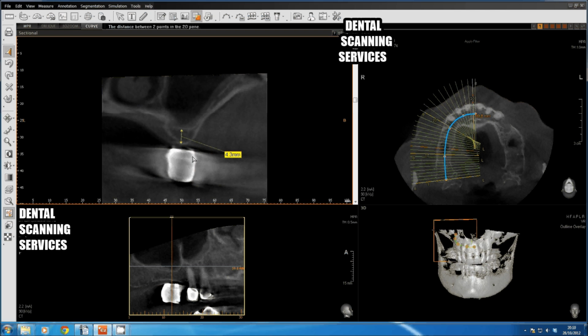Now in this situation, if you're experienced with the Summers technique, you can prepare the site to 3.3 mm and then use an up-fracture technique, allowing a biomaterial such as Bio-Oss or Osteobiol or whatever your preferred material is, and that can be very carefully inserted and spilled using the Summers technique, so you can create an indirect sinus lift.